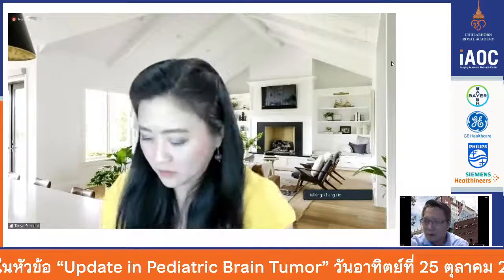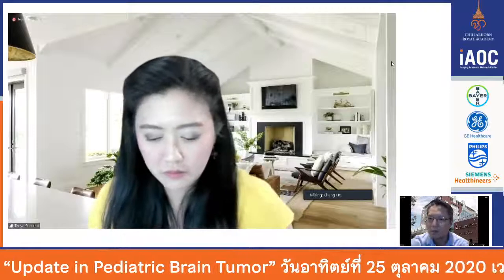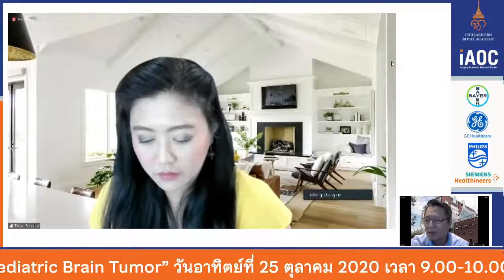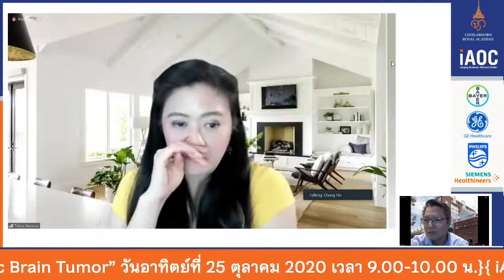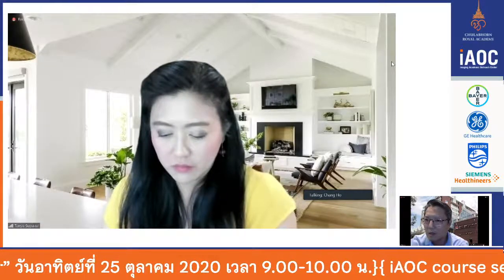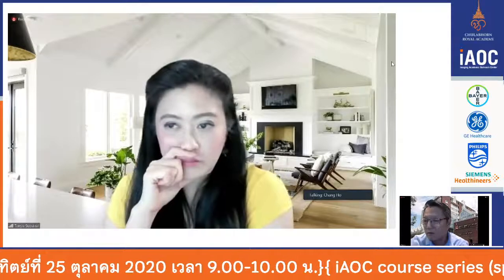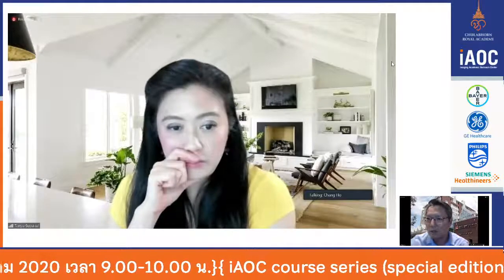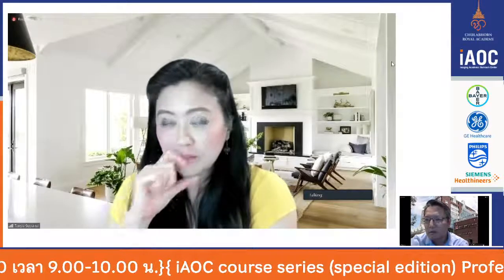And so I would say the contrasted perfusion techniques are probably the most robust. They're less susceptible to post-processing and differences in those types of things. So I would say DSC for sure, and then DCE as well. But DSC probably has the most bang for the buck, as in just looking at it, right? If you're able to have your tech post-process it and generate a cerebral blood volume map, you can clearly tell just on the color map whether it's increased or decreased. And it seems like, at least from early research that we're doing, if it has high perfusion, it probably means that it has a poor outcome.